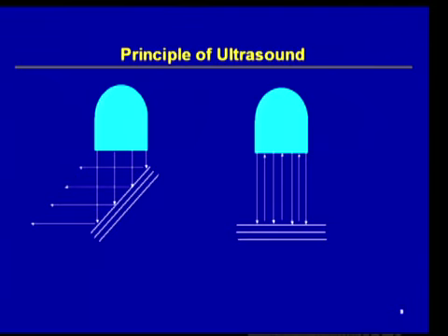The principles of ultrasound are easy. You essentially have an ultrasound wave that is generated through a transducer, which many of us refer to as a probe. That ultrasound wave then targets a structure. In this case, we're going to be looking at structures in the body. The ultrasound signal then hits that structure and is sent back to the transducer, and then the computer technology of the machine translates that into an image that we will see on the screen.